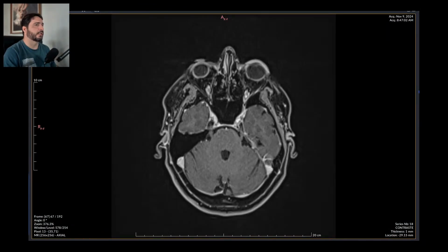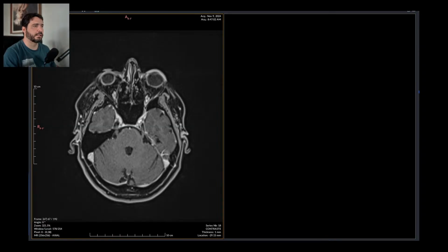And there is a very thorough report from March of 2023 saying it's a very serious exam, a very serious disease. So it's here. Both exams are here. Let's see how we can analyze it. So let's go for today's exam.